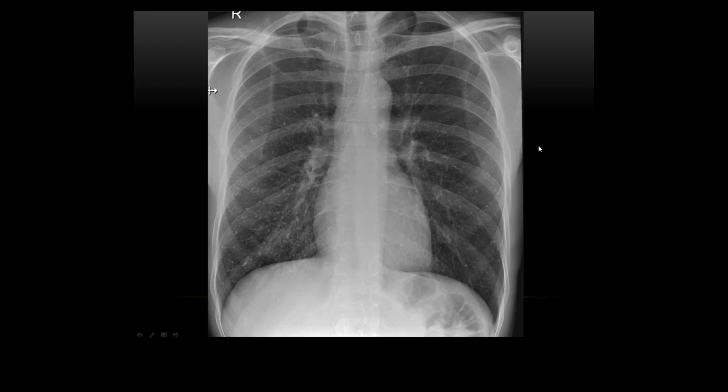You have nodular shadowing, which should be like this. With nodular, you kind of think, if I could get some tweezers, I could pick little nodules out. That's nodular. But kind of a mixture of the two. So yes, you can have a nodular interstitial disease pattern, but this isn't actually sarcoidosis, although in sarcoidosis you do get nodular changes.